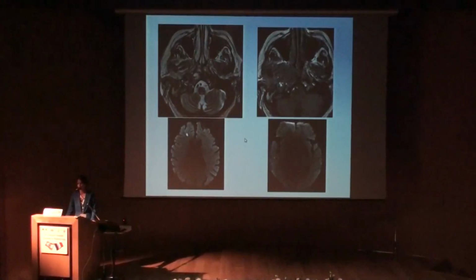This is a case of skull base osteomyelitis, complicated with arterial dissection. You can see the infarct in the brain.